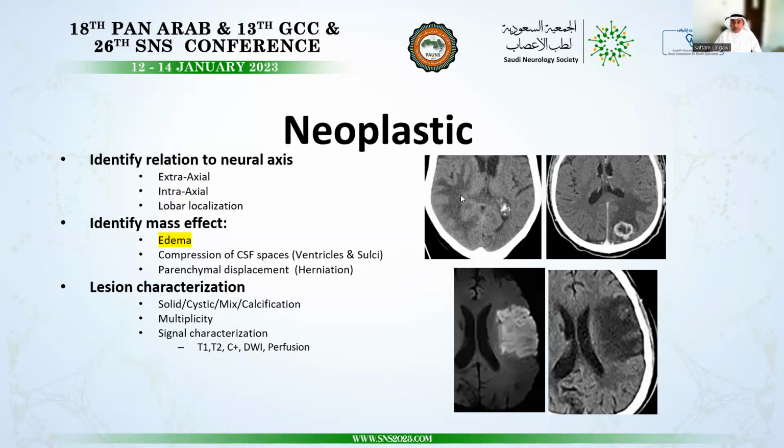Mass lesions within the brain, may that be a neoplastic process or an infectious process or even a hematoma, incite what is known as vasogenic edema. Vasogenic edema is edema of the white matter, purely white matter. It interdigitates itself as fingers in gloves into the depth of the gyri. It spares the cortex itself.